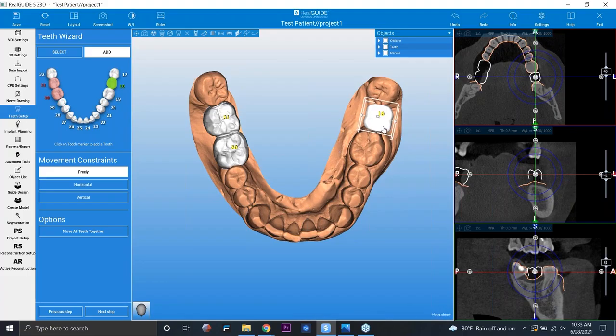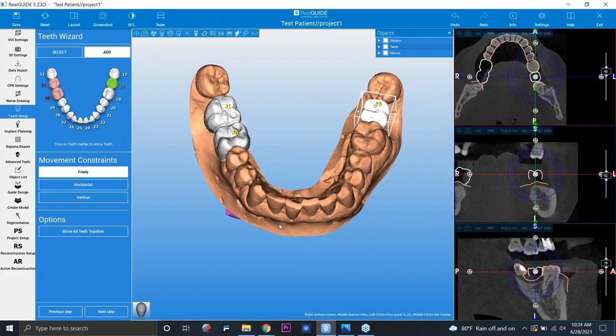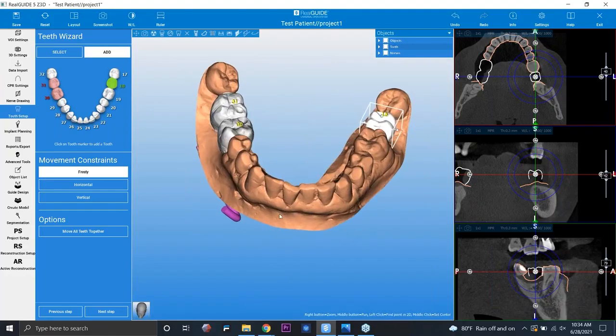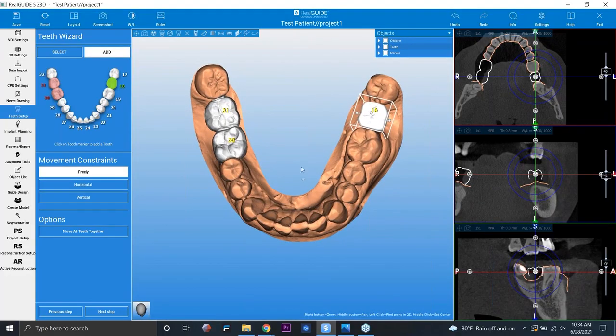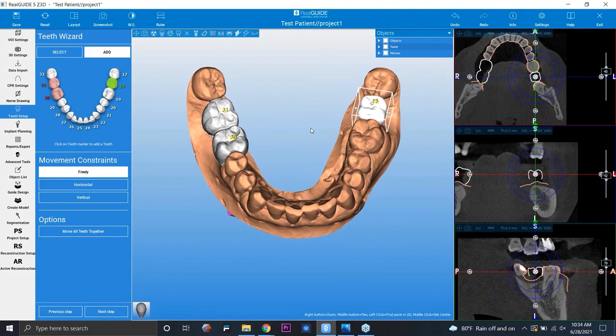A couple things to keep note of is, of course, as you can see, everything I was doing was purely visual. I wasn't taking into account the patient's opposing dentition or their occlusion. Also, you can see that I can only stretch and compress it on a general level of customization. I'm not able to go in there and actually edit in detail the different cusps of the teeth. It's just going to have a generic molar shape. So just keep in mind that in the absence of a wax up, this Vita tooth is nice for spatial and angulation reference, but it's never going to be true restorative value like an actual restorative wax up. So just use that Vita tooth with a grain of salt.